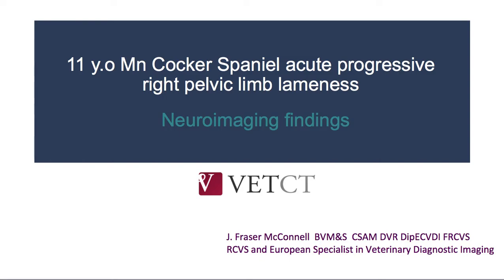Everybody, and this week's case is an 11-year-old neutered male Cocker Spaniel presenting with acute progressive right pelvic limb lameness. So let's have a look at the MRI and see what that showed this week.